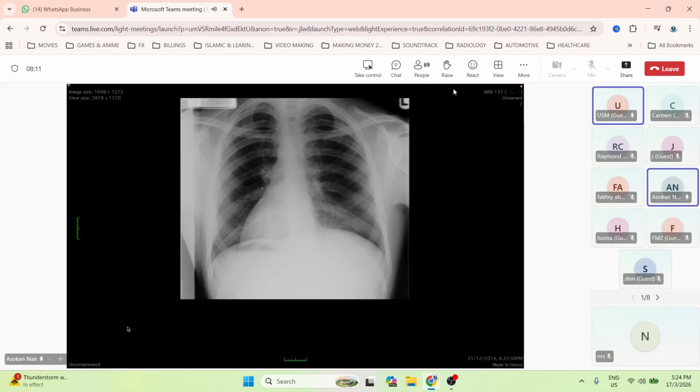First thing you want to do is make sure the marker is placed properly. Otherwise, you're just making a wrong diagnosis on the wrong person. That's what they will test you on in the viva. In everyday work, first thing you want to make sure the marker is correct, especially in chest X-rays in cases like this, because it makes a lot of difference.